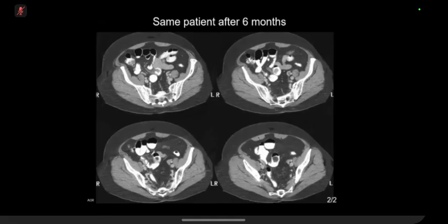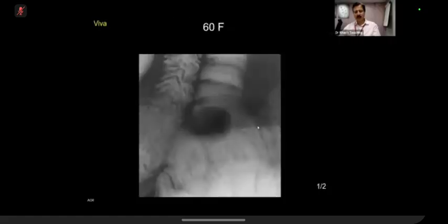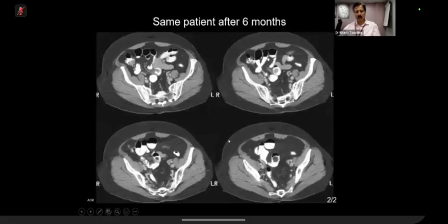So is it like a diverticulum? Actually, what has happened is that there is a mass within the lumen, and because of time I cannot give you in a viva format, but it is a classical exam case, after 6 months it is causing a bit of intussusception.